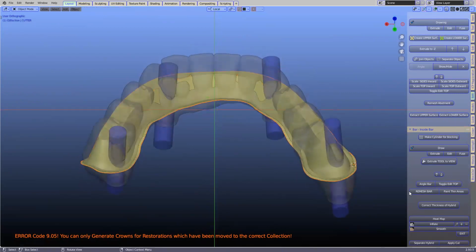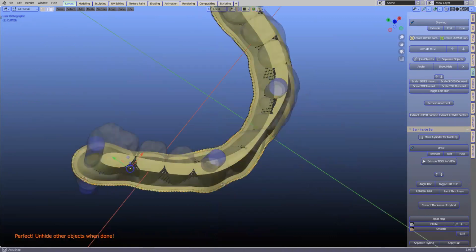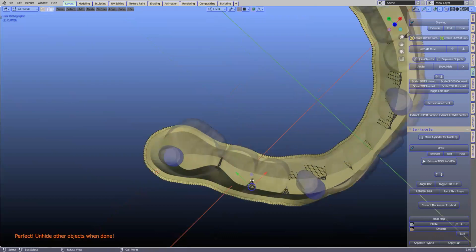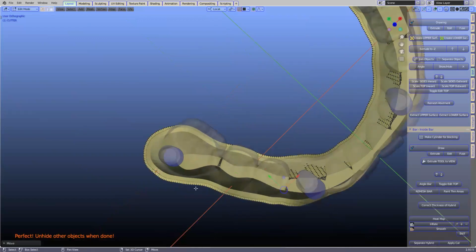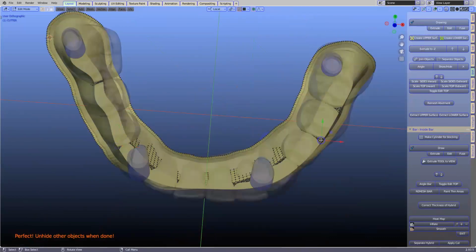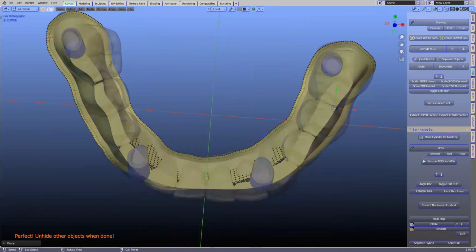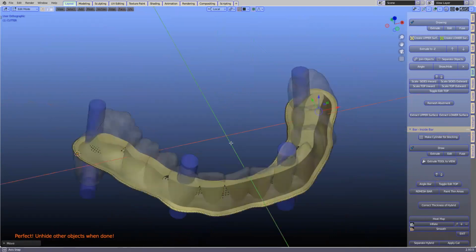So here what we'll do is we're going to now remesh the bar. I'm going to be taking from the top view, I'll manipulate this mesh, and we're going to change the structure a little bit like this. Let's just pull this out this way, like that. Here as well, using the G key. Something like that. Yeah, so we've got exposure over there. We've got some exposure over here as well.